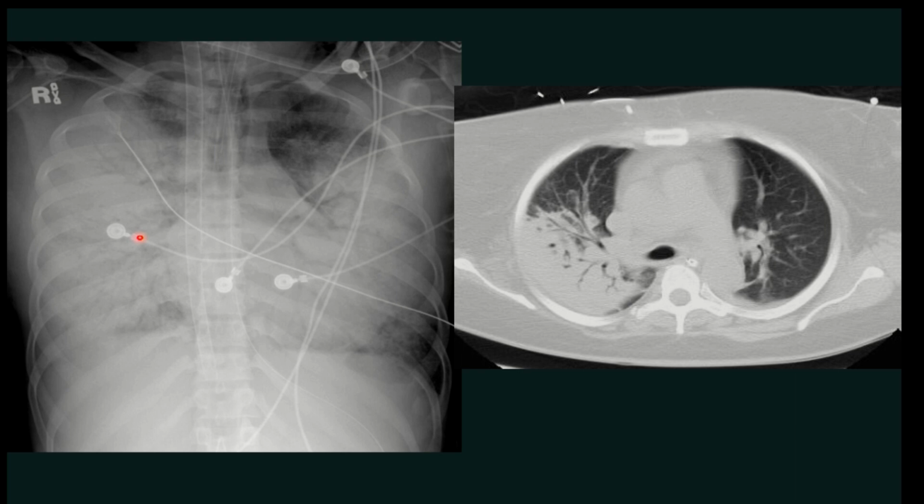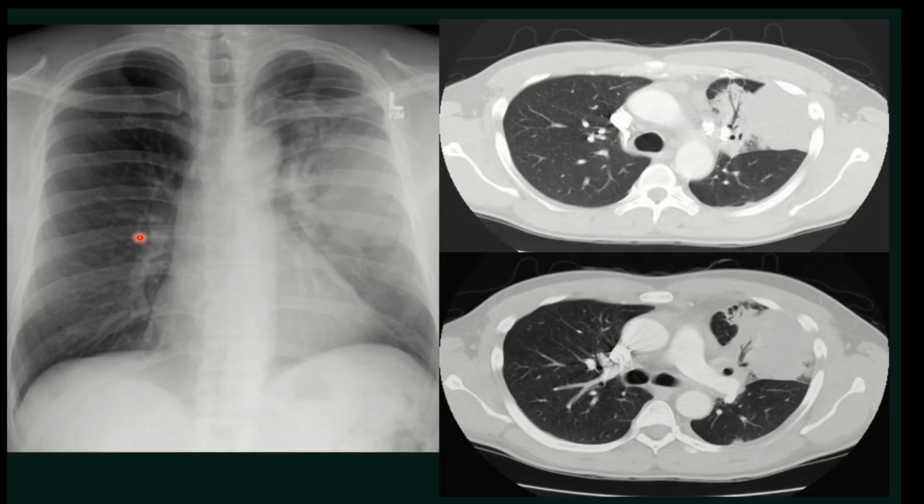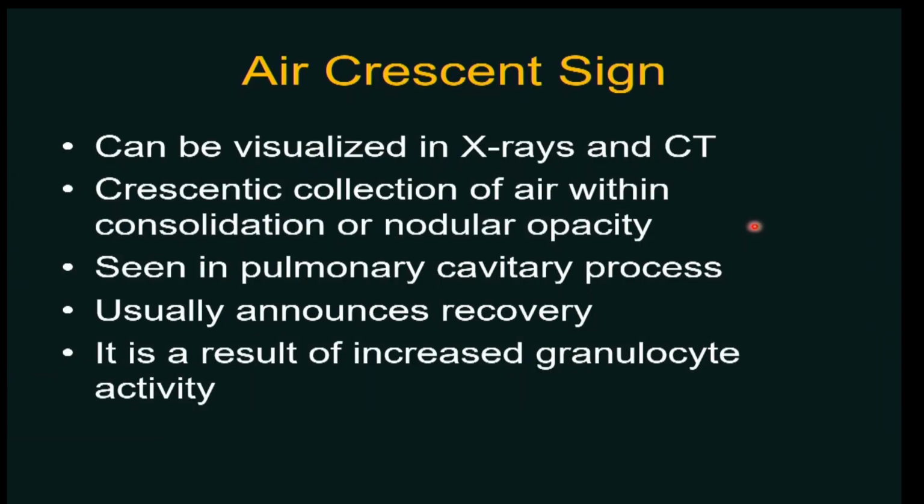If needed, we might be in a better position to talk about it on an HRCT. As you can see, we have a CT image also, and I'll show you a next example. You can see here these lucencies have reduced, and if the patient is not responding to treatment, this may increase, in the sense the lucency will be lost and it will be completely homogeneous.